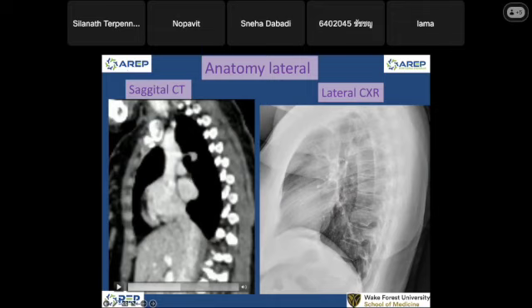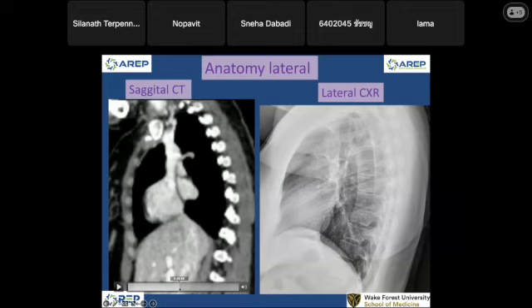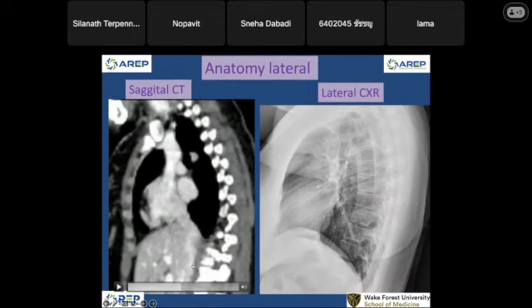And then the inferior vena cava is here. You can see, if I can make it, this is a column of the contrast. It's coming into the intrahepatic IVC, and then it is draining into the, see that? So this is draining into the right atrium as well. So it's from the top and from below. It's draining into the right atrium.